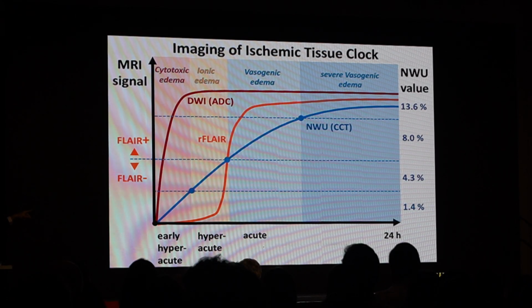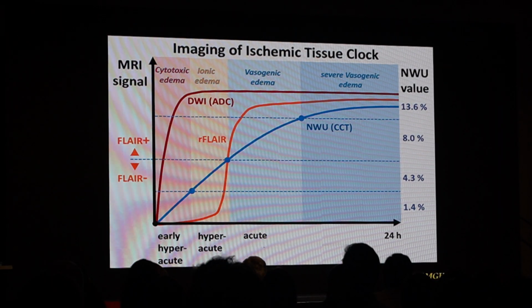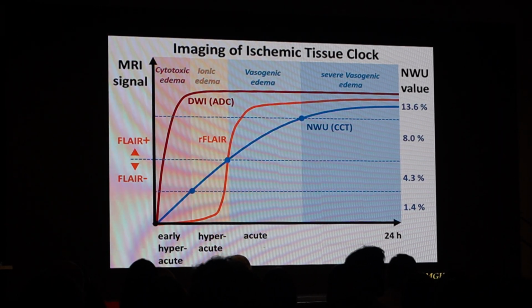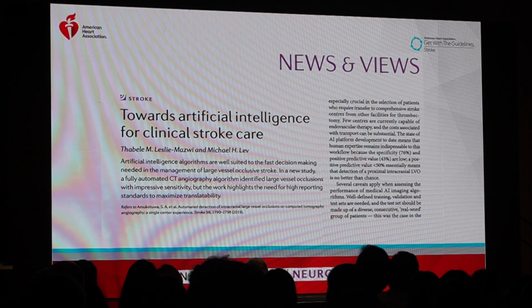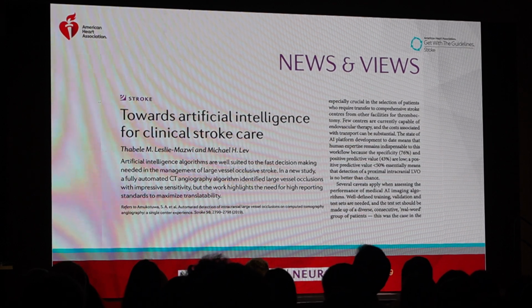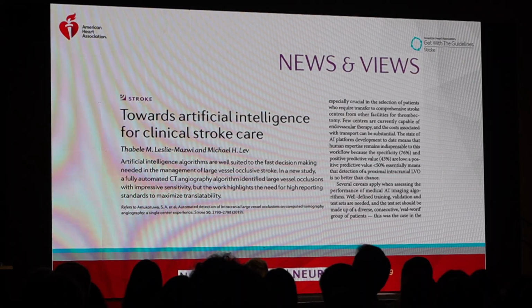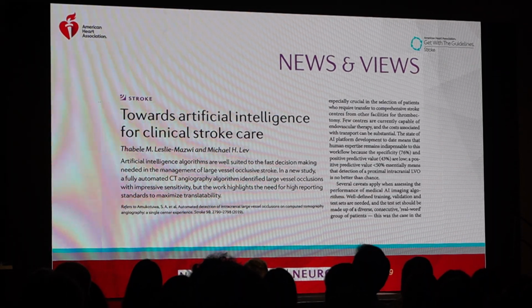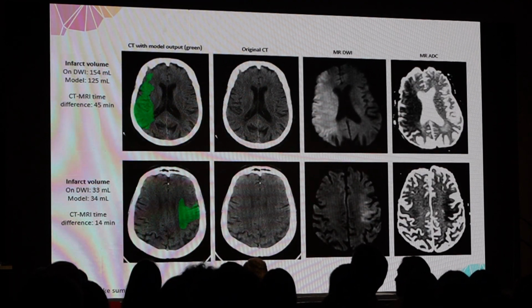So you're basically getting a very mild osmotic edema, and that's what ionic edema is. And you really can only see it on CT. So it's very cool that CT, in some ways, is actually better than MR for all of this. And so we leverage this, and we've been doing a lot of trying to develop some AI software that could also detect this early.